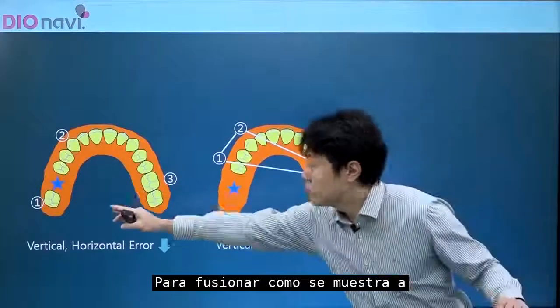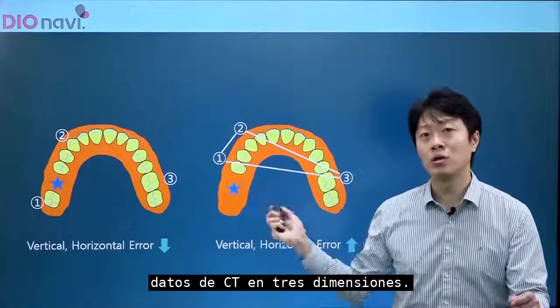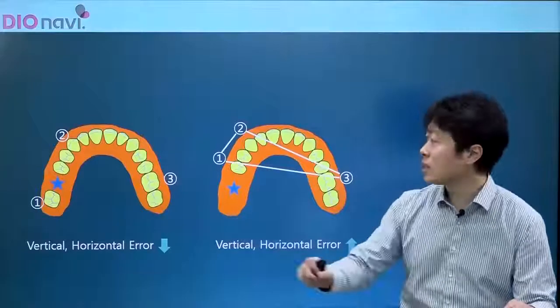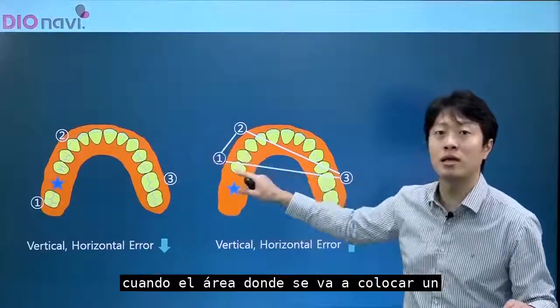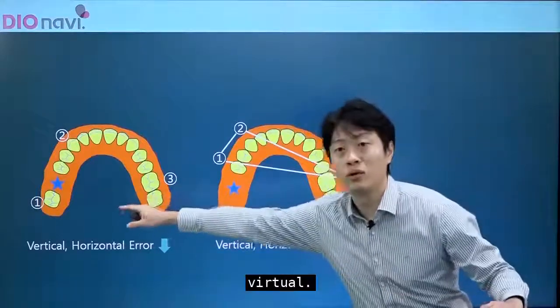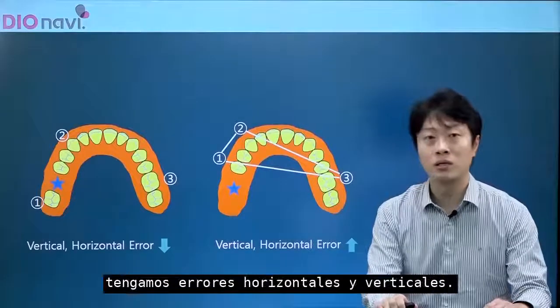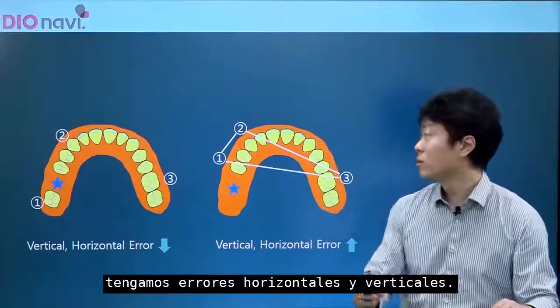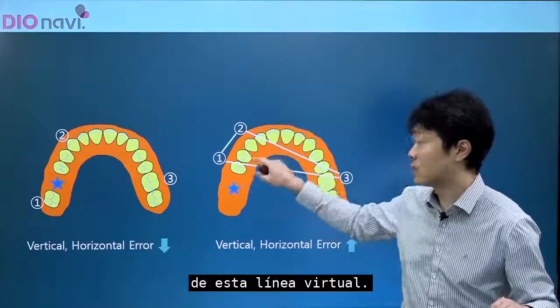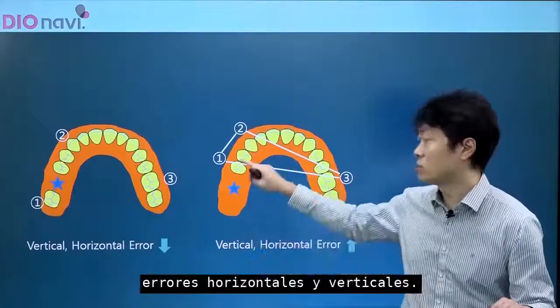In order to merge like the following, by adjusting the ratio of CT data 3-dimensionally, we usually use these 3 points. With these points virtually connected, when the area where an implant is to be placed is located inside this virtual line, we can see that we are less likely to have horizontal and vertical errors. When the area to be placed is located outside this virtual line, we know that horizontal and vertical errors are more likely to occur.